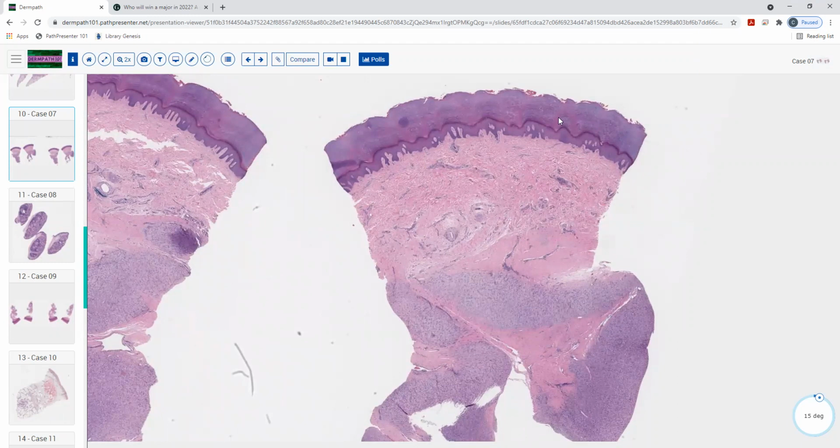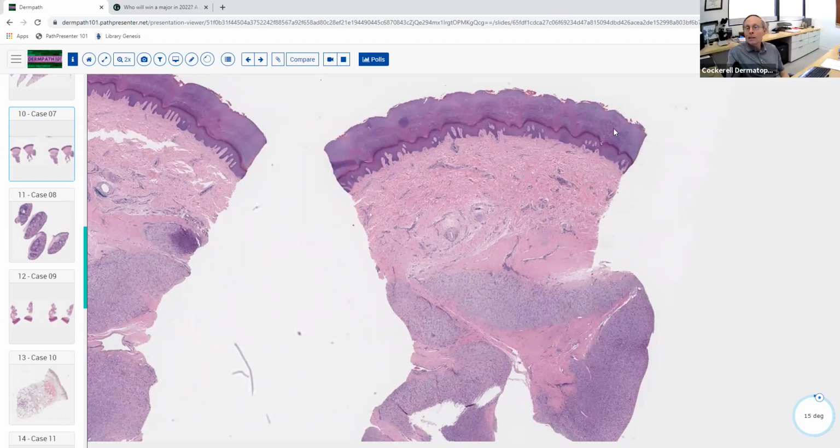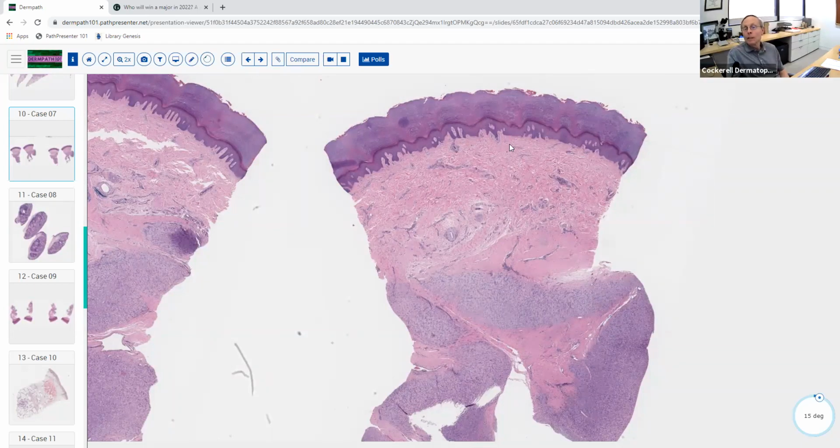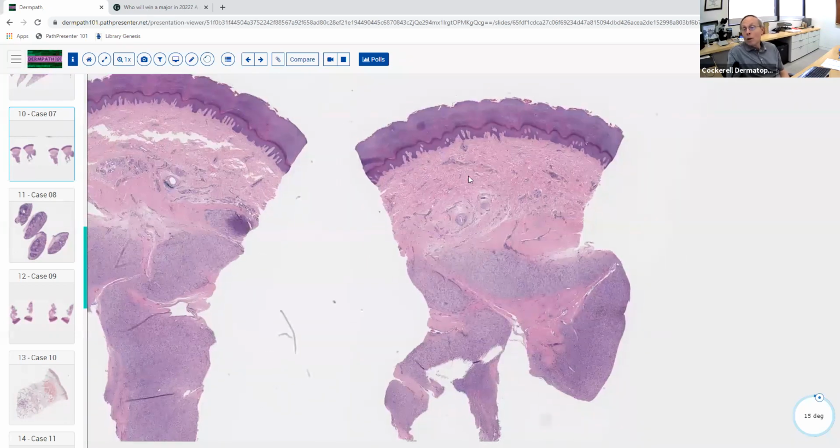But if we saw hair follicles and we saw this markedly thickened cornified layer, what would we say had to have happened to the skin? Like lichenification? Yeah, good. It has to have been rubbed. So that's just a clue. Here, there's no follicles, so it's more likely acral skin. It's not lichen simplex chronicus.